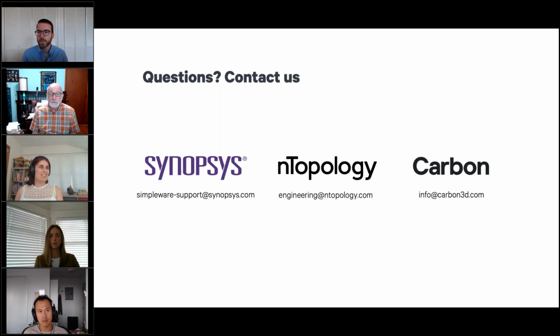Why don't we start? I guess I can start with the patient data. The Simpleware ScanIP platform is run locally on your computer. So no patient data needs to leave your hardware. Now, that's not to say that if you're working in a hospital setting, you might have dedicated hardware to run this kind of solution, in which case you're still within your secure environment.